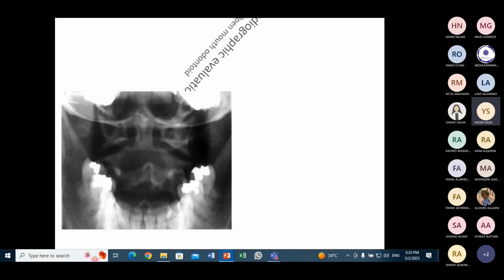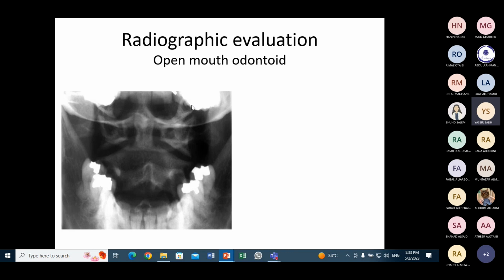Next to the cervical is also an additional or optional view for assessment of the dens, the odontoid process of C2. So this is the C2, and this is the lateral mass of C1, and this is the dens odontoid process. Look for this odontoid process, which is projecting between the lateral masses of C1. The space between the odontoid process and the medial edge of the lateral mass of C1 should be equal. This distance should be equal to this distance.